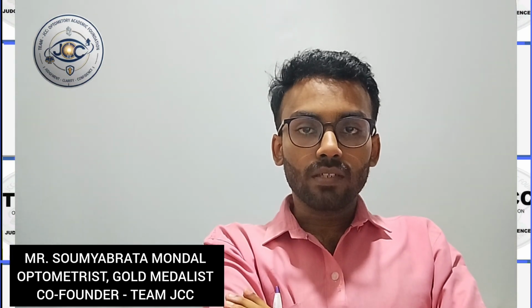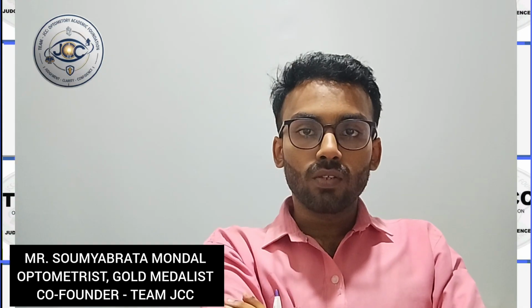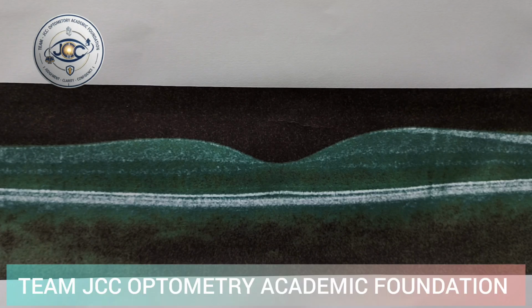Before we start, I just want to show you a normal picture of an OCT scan. In this picture, which is color coded and quite old in the clinic, we identify the layers by the hyper-reflective and hypo-reflective zones. In this image you can see a white line, that is the RPE layer actually.